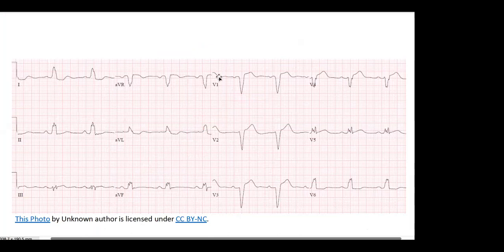Yeah. In the beginning, please watch what I'm going to do right now. This is my yellow line. So as you can see, you have the isoelectric line, and you have the ST segment, which is a bit elevated. Yeah. In this case, you know that the most dangerous myocardial infarctions are mostly involved with ST elevation in V1 to V3.